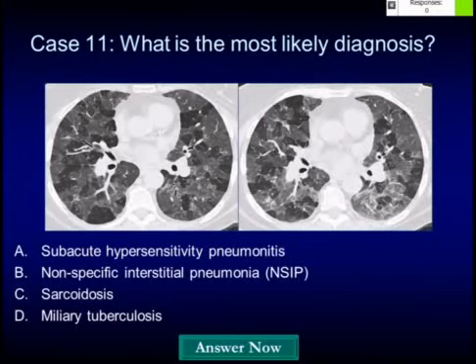All right, next case. So on your left is inspiration, on your right, expiration. Same patient.